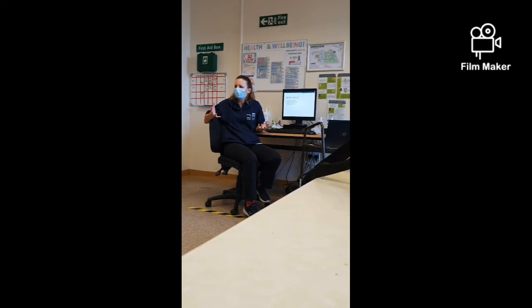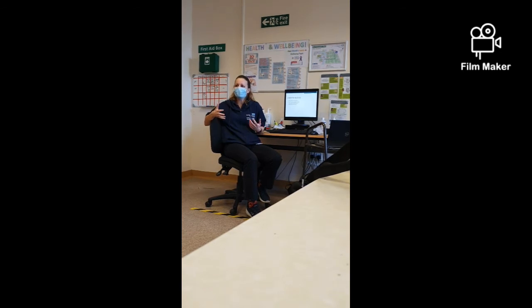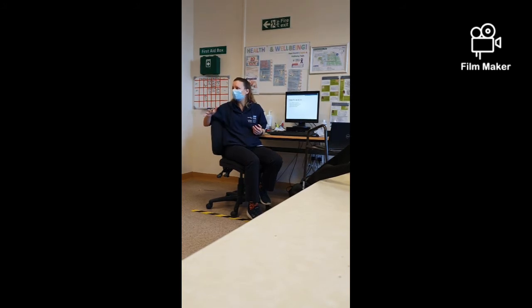If you're looking at the soft tissues, what might you find in the soft tissues on a chest x-ray? You may not have covered this, so don't worry if you're not. Like tumours? You potentially could, yeah. Has anyone heard of surgical emphysema? Yeah. So surgical emphysema is air trapped under the skin, and it feels a bit like bubble wrap. And once you've felt it, you'll know. You touch it and it crackles, like bubble wrap under your fingers.